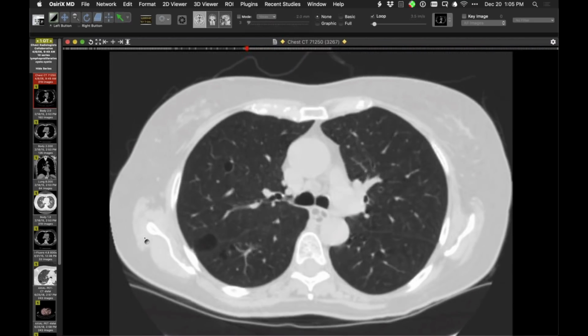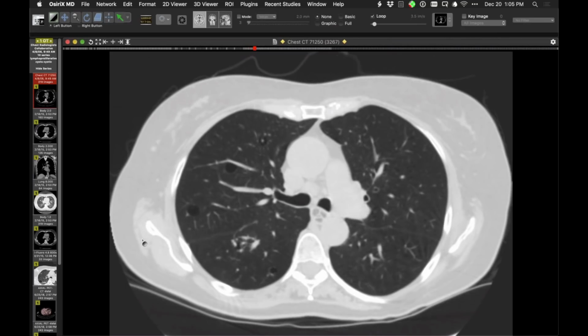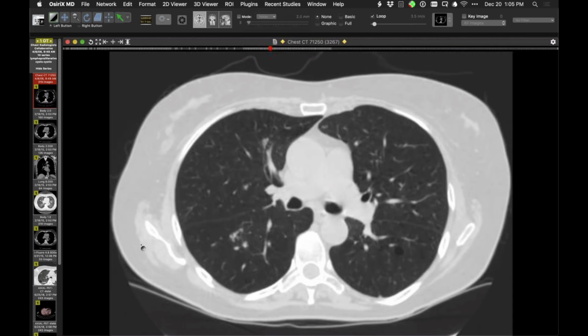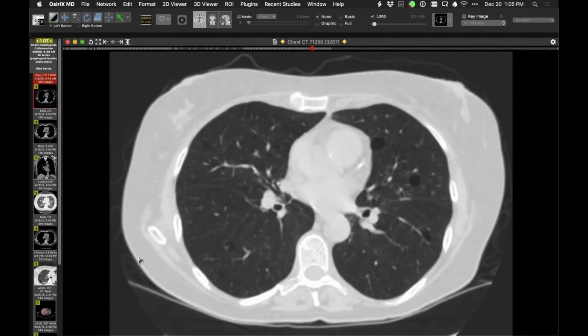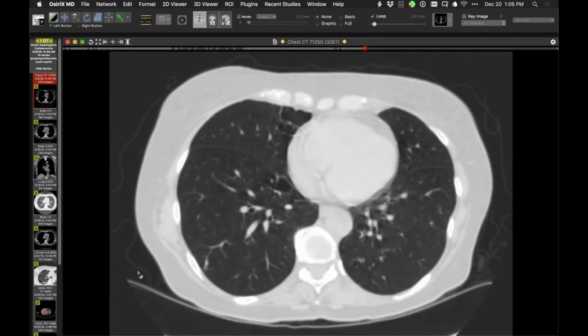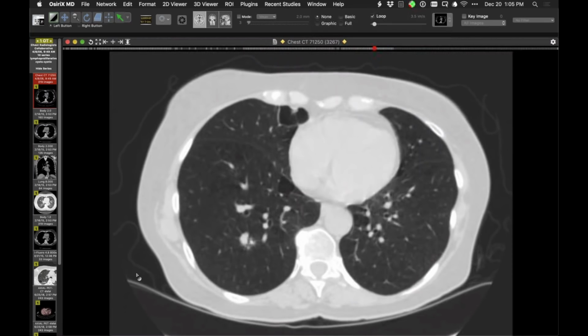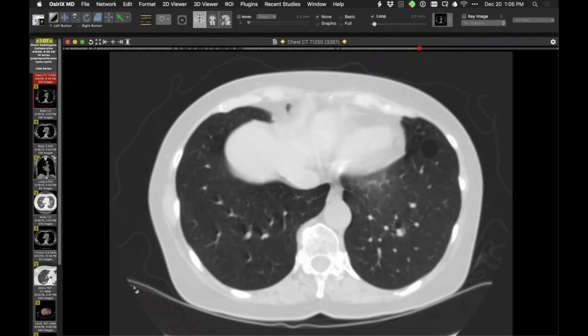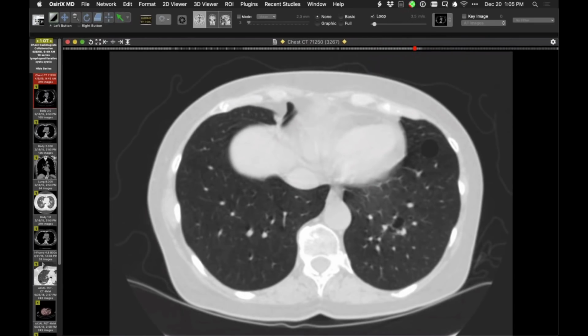And you'll see that nodular opacities are present in the lungs as well, many of them in very close proximity to the cystic lesions. And they are pretty much everywhere. Here's one that's quite large in the anterior medial right middle lobe, and more of the same.